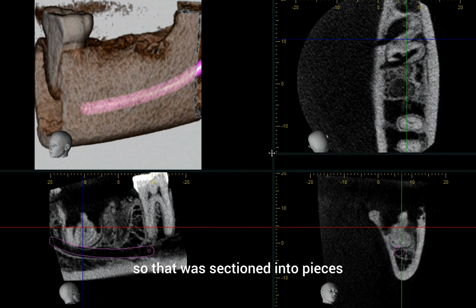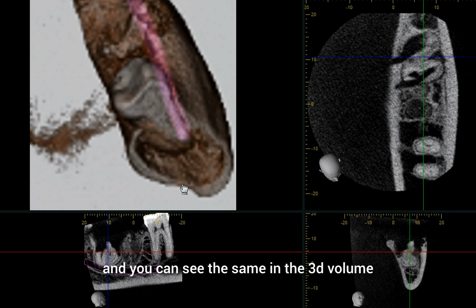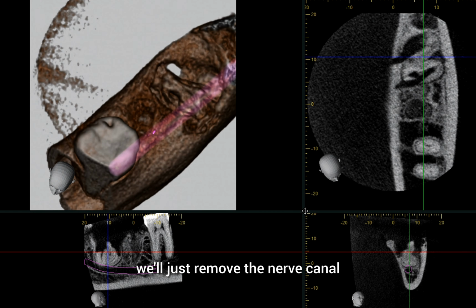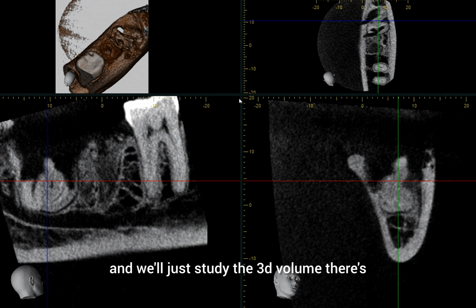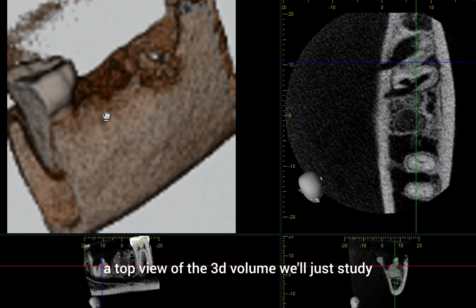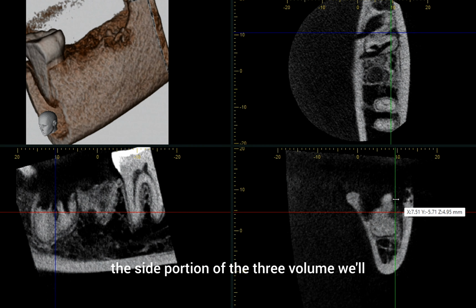So the tooth was sectioned into pieces, and you can see the same in the 3D volume as well from different angulations. Okay, so we'll just remove the nerve canal, and we'll just study the 3D volume. Here's the top view of the 3D volume. We'll just study the side portion of the 3D volume. So here's the side portion of the 3D volume.